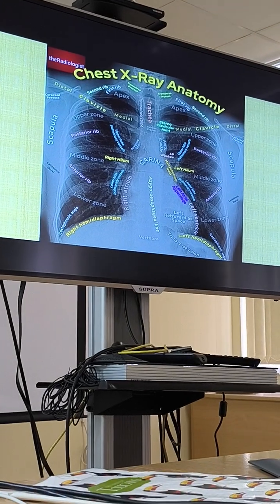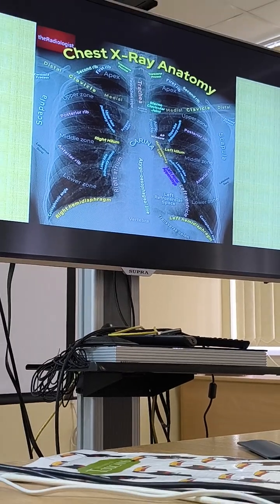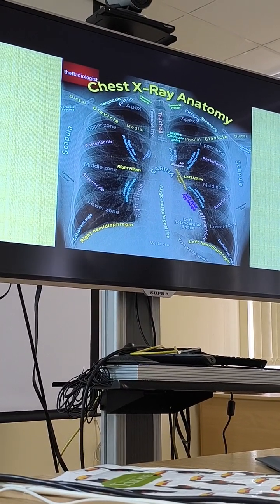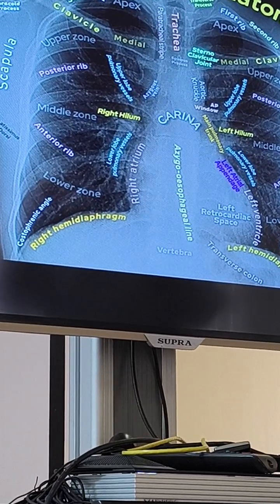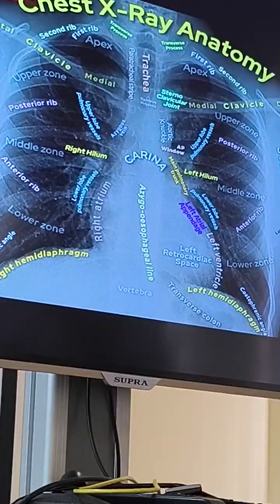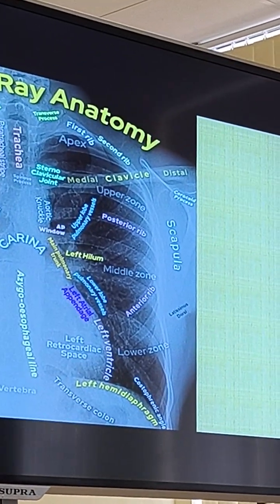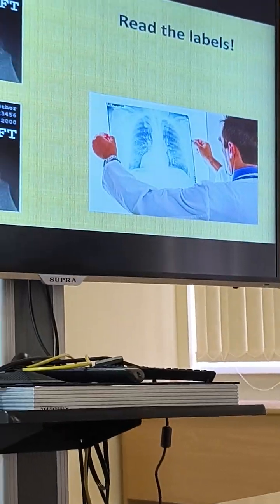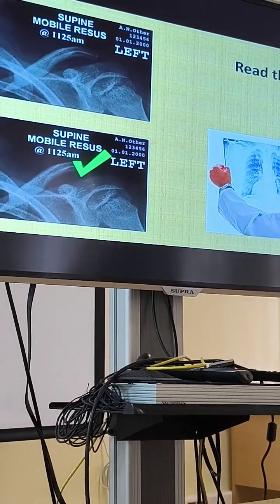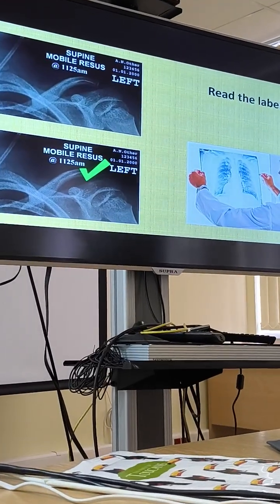Because it's kind of a summarization, and probably you'll find something new. First of all, I like this picture, and I really recommend you to meditate on this picture in a close view, because all the structures which we discussed, how they should look, are clearly seen there and they are labeled. So I really recommend this picture just to keep in mind what we should see. And our approach works not only with X-ray, you can use it looking at any image.